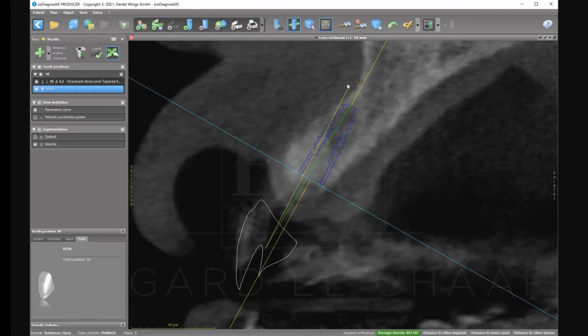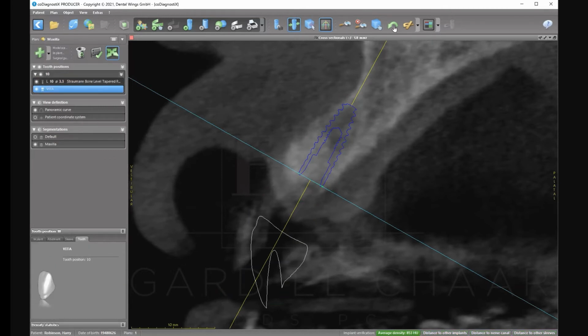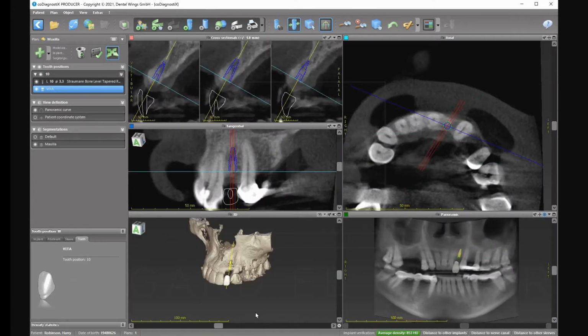No, not that. Sorry, I screwed up here. I go back. Actually, yeah, you can do this. Okay. Go back. Yeah, this is correct. All right, so look, there's something that happened here. No, see, I went back to 0. Okay, not a problem.